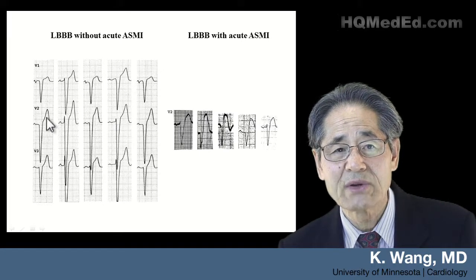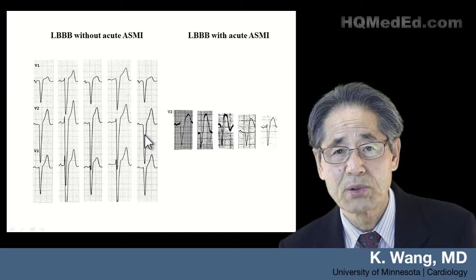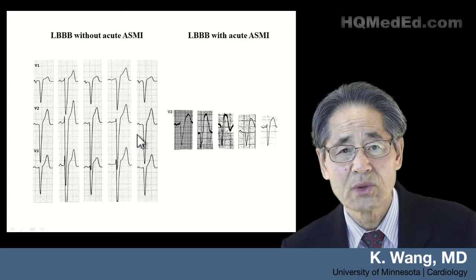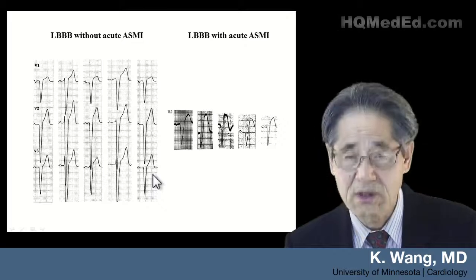Here, T wave is all upright, discordant from the major component of the QRS. I hope you will appreciate the difference between LBBB without and LBBB with anteroseptal MI.